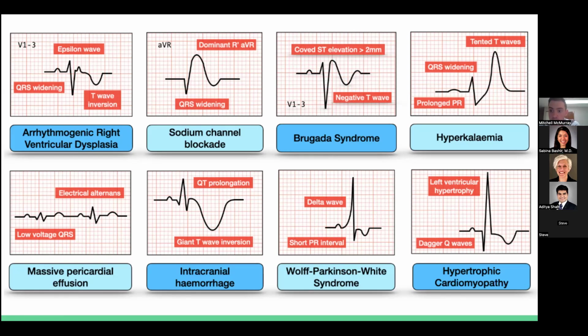Hyperkalemia is a big one. You'll take care of some people on your medicine rotations that have end-stage renal disease and miss several sessions of their dialysis. And the classic is that you get really elevated peaked T waves. But that's only the first sign.